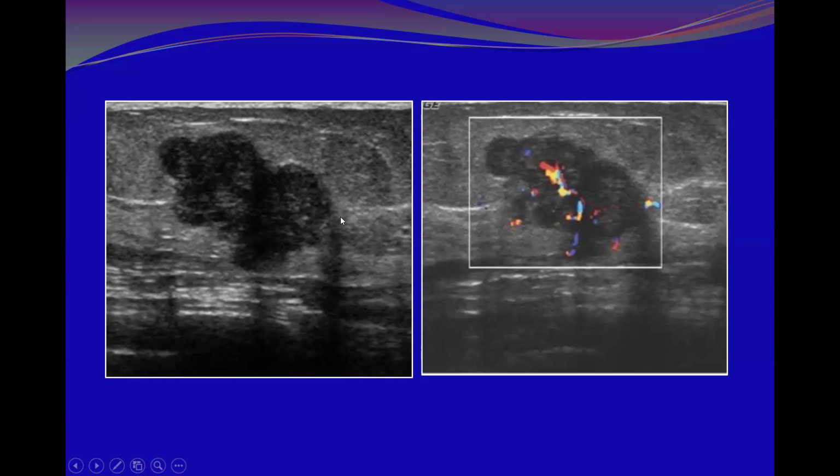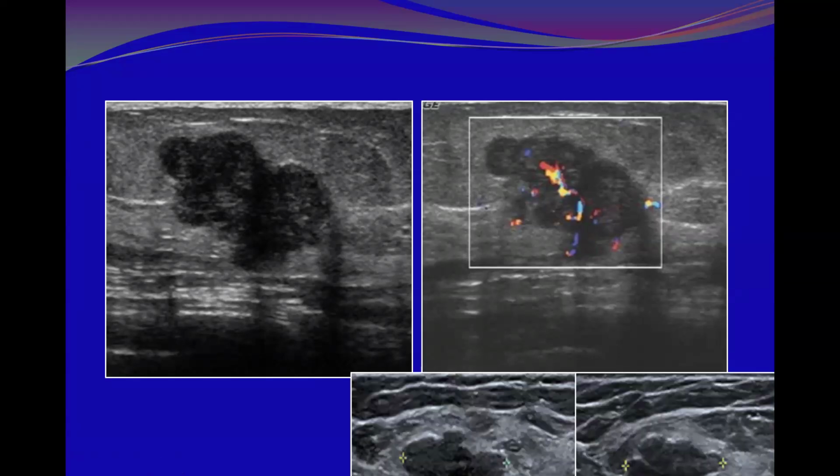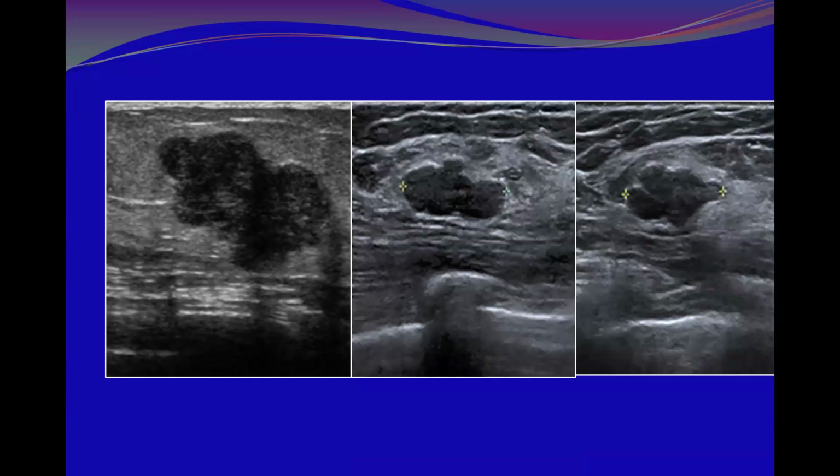And even here, there is some hyperechoic thickening, a focal area of echogenic rim. And there is mixed posterior enhancement and shadowing, and there is significant intramass vascularity. So all features are suspicious.